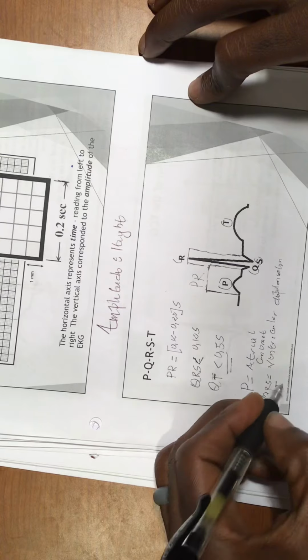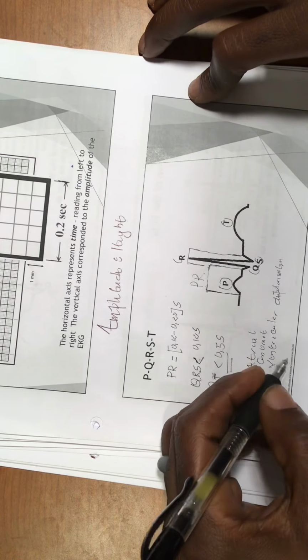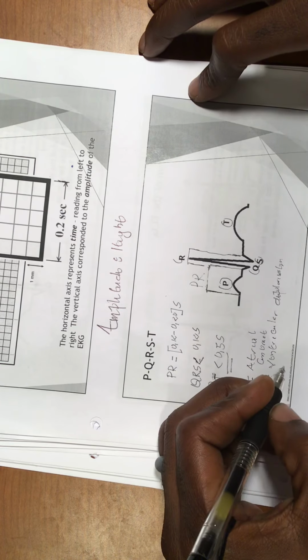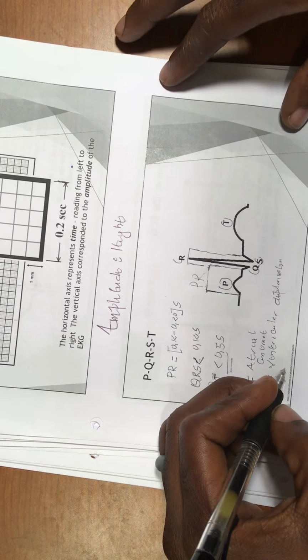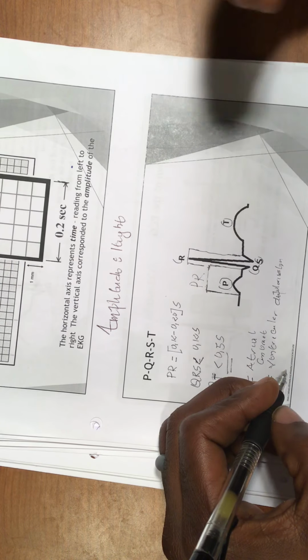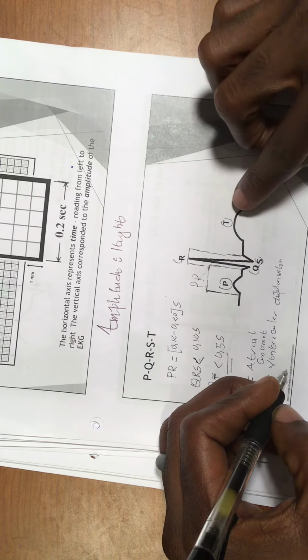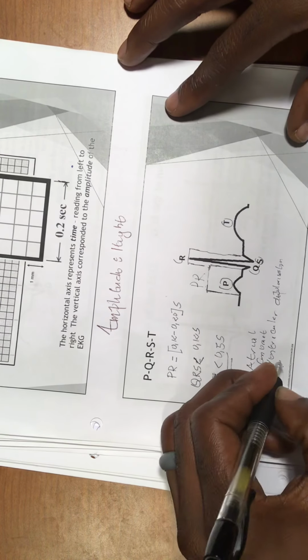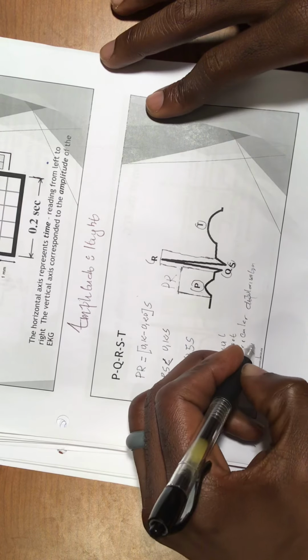And this T wave right here, it means that this is the time that you have your muscle, the myocardium. This is when you know that the heart is filling with blood in diastole, and this is the time of repolarization. I put it right here, you can see it.